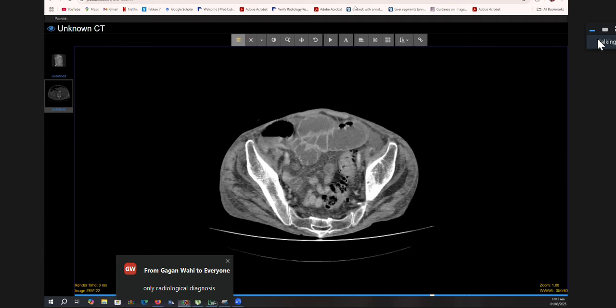Okay, have a look at the next one I've sent, which is just above the three comments.